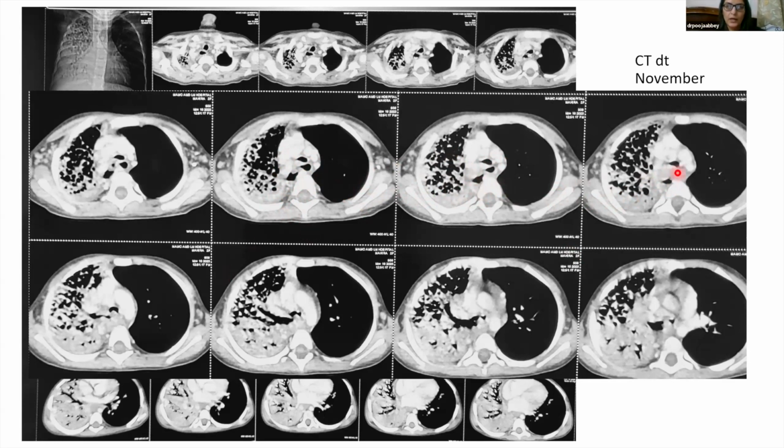Then looking at the airway itself. This is the esophagus, which is collapsed now. We can't see the esophagus. That's the trachea, the airway and the carina here. Again, this is the right-sided bronchus, and there is some abnormal soft tissue here. So after looking at all of this, it was very confusing. What are we dealing with here? I was still not too sure what was happening.